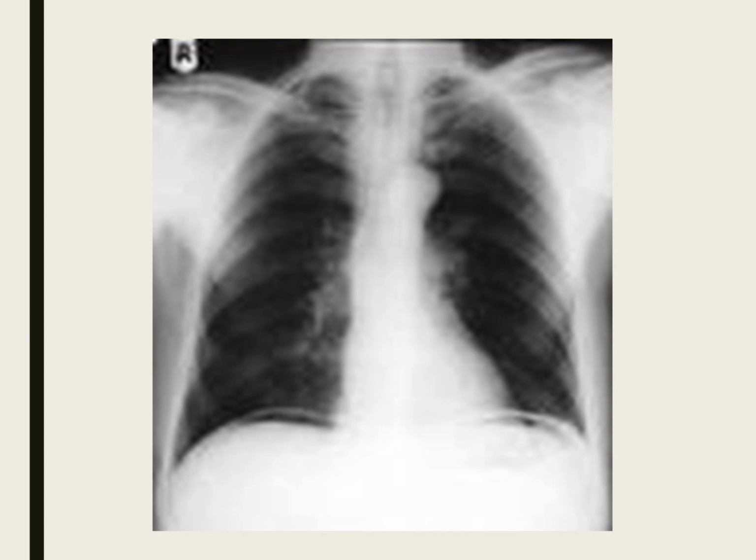So there's air between the diaphragm. So this is intra-abdominal air. This is like somebody who perforated some viscus in their belly and has got air under the diaphragm. So this is like an acute abdomen patient, right? And everything else, lungs look pretty decent here.